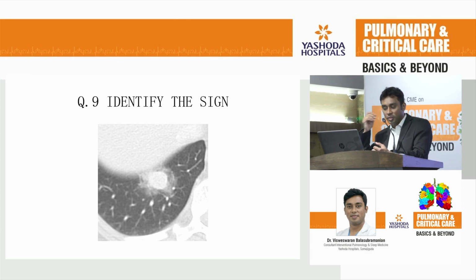So this is a case of invasive pulmonary aspergillosis. When you see the halo sign, it is an early form of invasive pulmonary aspergillosis. In later forms, this nodule will go in for cavitation. So when you see cavitation, that means it has already become a little advanced. In early stages, you will get this halo sign. In which other condition will you see halo?